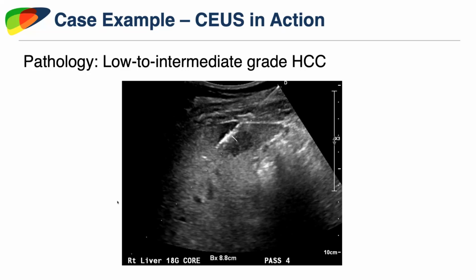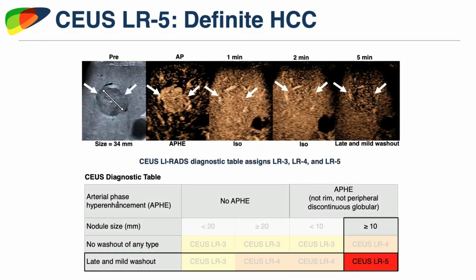Since this case, I think the comfort level at our campus has gotten a little better. Some of these cases come either from my institution or from our LI-RADS manual.